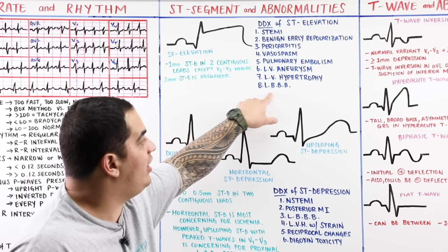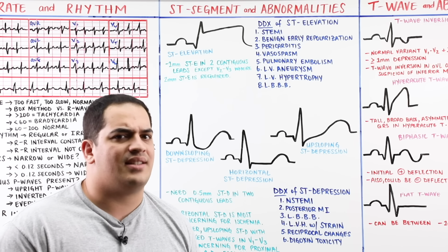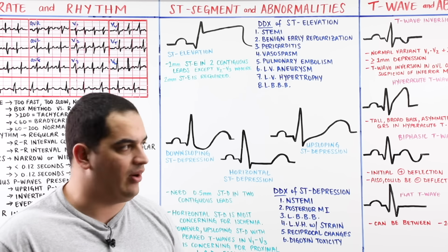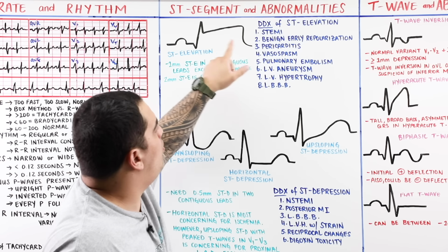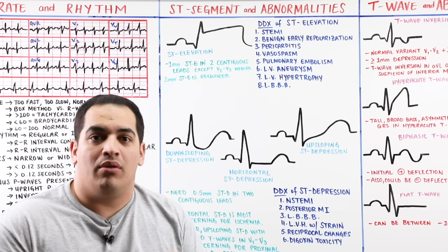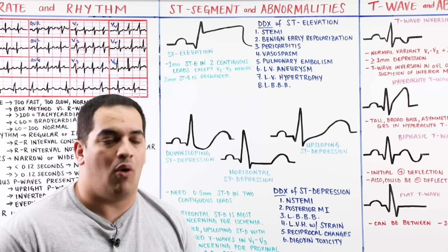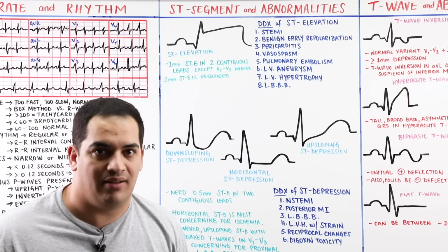And we'll actually have a pretty good conversation about left bundle branch blocks in the setting of a STEMI, and we'll talk about Sgarbossa's criteria for that. But we're going to try to go through a bunch of EKGs to figure out, oh, we see ST segment elevation. Which one is it? If you don't think about it, you can miss it. So always have a good differential and rule every single one of them out effectively.